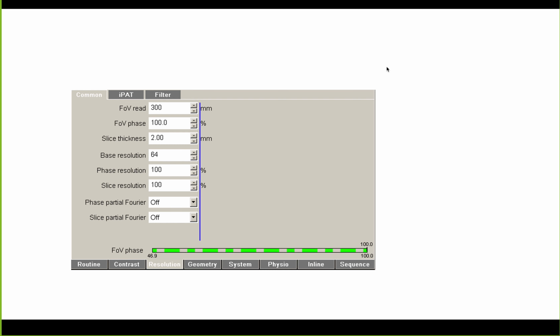I know that the participants from CMRR or from Paris, actually I think Paris you are also still on a VB17, but from Liège certainly you have a newer system, the VE12 I believe, which looks very similar. You have these different task cards and sometimes even sub-task cards, and there are a lot of different sequence parameters that determine, for example, how many lines you have in your back and forth pattern, how big your back and forth pattern is, and then how big you jump between different back and forth patterns.